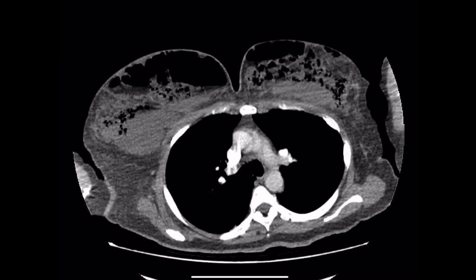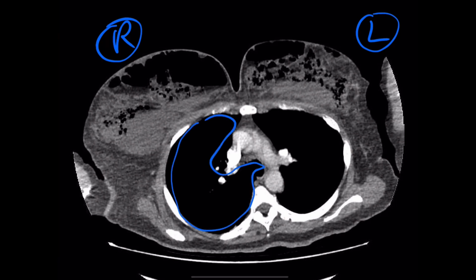So, Colin, we're going to finish with something kind of out there. This is not in the abdomen, but this is really abnormal, and bad things happen to this patient. Very grossly abnormal picture. Again, we've got an axial slice, but this time we're looking at the thorax. And again, we've got the patient's left and the patient's right. Why is this the thorax? Because we are seeing black as air. Lungs. A pair of lungs.